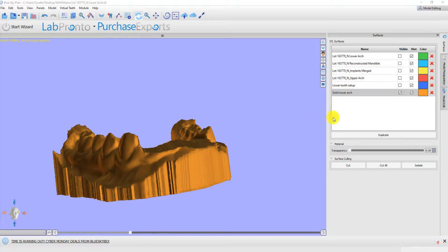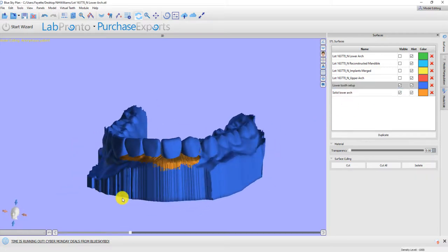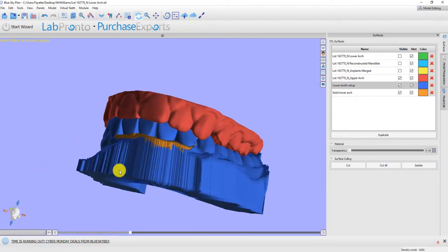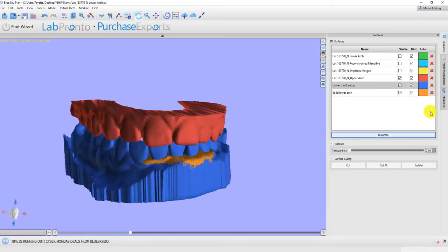But when you place the teeth, then we're able to get something like this. And the way I determined the positions was also to use the upper dentition as well. So this is not going to be perfect, and we'll probably have to make some occlusal adjustments here, but you get the idea.